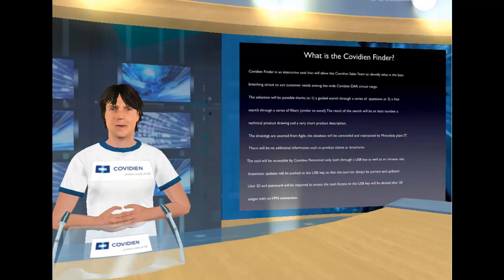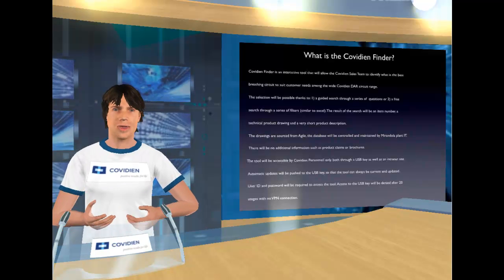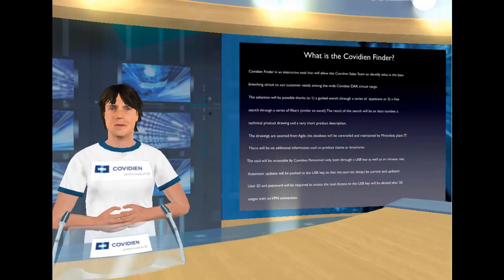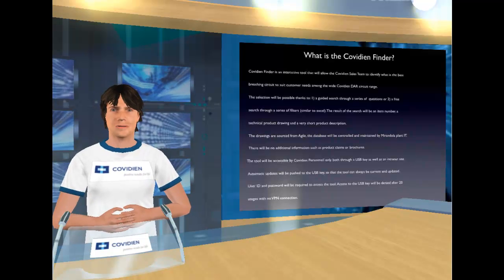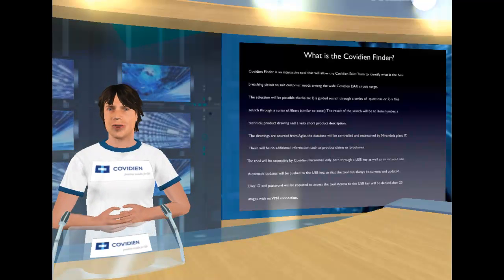The Covidien Finder will support your knowledge of the circuit products available and will allow detailed analyses in case of custom modification requests: change components, compatibility with the chosen circuits, and a time requirement estimate based on standard status and time cost ratio. This program will update the database every time you log in.